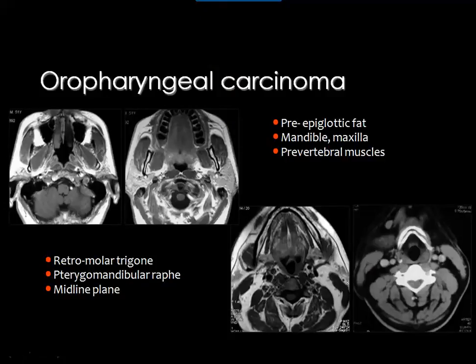Okay, now we have discussed the lesions which can affect this area, and we have mentioned from the lecture of the parapharyngeal spaces that most of the lesions arising in the pharynx as well as in the mouth floor and the tongue are usually carcinomas. The malignant lesions are usually carcinomas, most commonly of the squamous cell type. And whenever you see a lesion in this area and you suspect that this lesion is malignant, then you have to evaluate the extensions of this lesion into these areas.